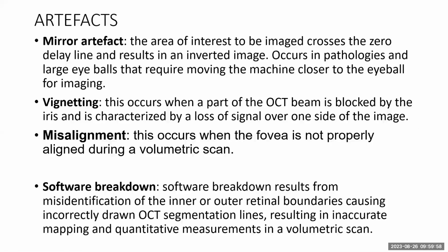So, in conclusion, the other thing we have to watch out for is artifacts during the OCT scan. They affect the quality of your scan and they reduce what you actually get back, okay? Artifacts could come from the patient, the machine, the operator, the positioning of the patient, and all. These are some common ones. If the pupil is poorly dilated, you have the laser light being blocked.